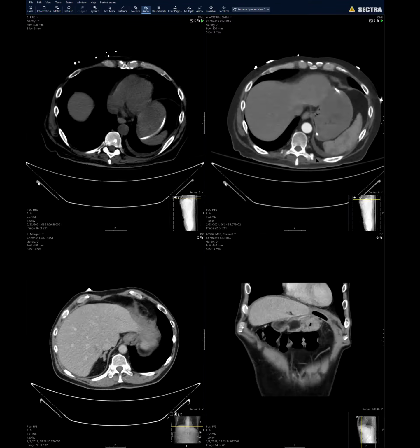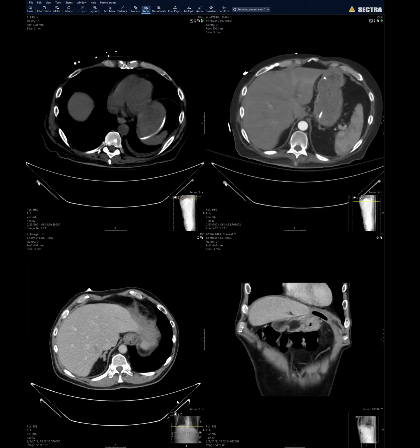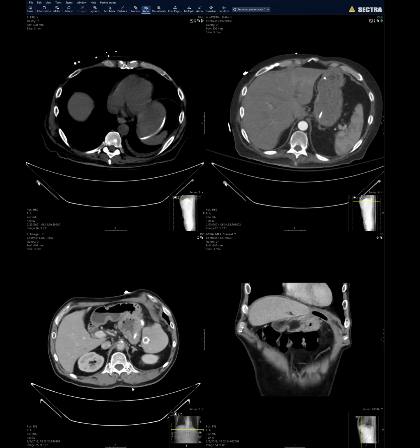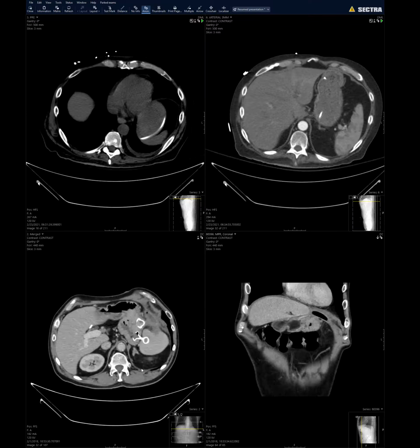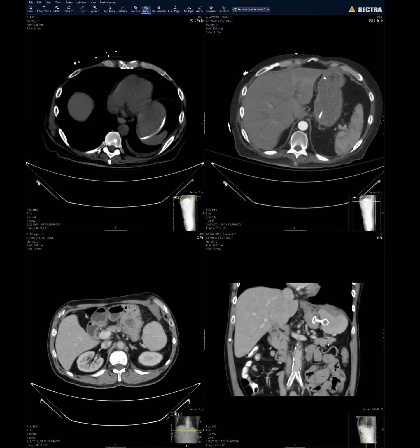Yeah, so these things can happen. Of exsanguination. And this is sort of a companion case, except look where the cystgastrostomy stent went in here. There's 2 of them. One is in the collection with the other end in the stomach, but then you can have a case series on malpositioned Axios. This one went into the spleen, obviously. This one, they did an emergent removal.